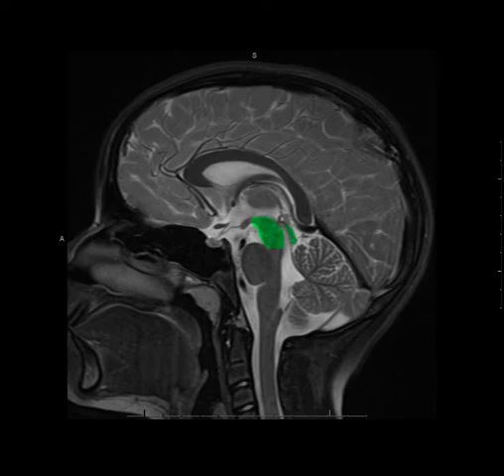So the next structure we'll talk about is the midbrain, or mesencephalon, conveniently located in the middle of the brain, outlined here in green. The main structures I want you to identify are the most dorsal part, called the midbrain tectum, that is Latin for roof. It's the quadrigeminal plate, so called because it has four brothers, the superior and inferior colliculi, the paired little bumps on this structure, also called the tectal plate. The floor of the midbrain, if you will, is referred to as the tegmentum. Tegmentum is Latin for covering, not for floor actually, but you can think about it as the floor.